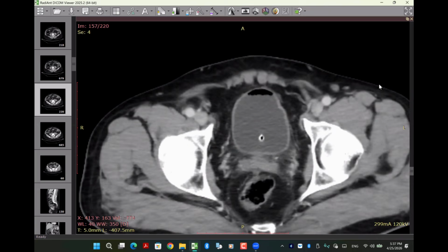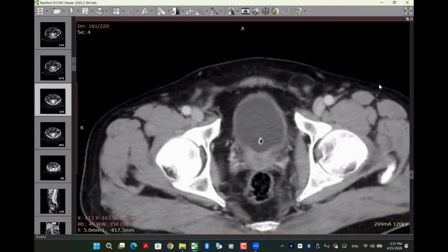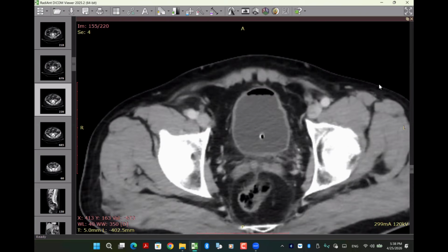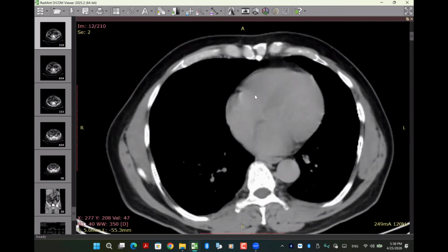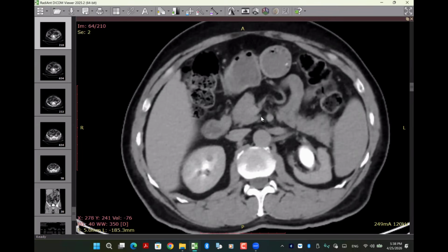Let me stop you for a second. Before the cystoscope, what else can you do with this study? Are you still missing a very important phase? We can see the delayed images of the study. Okay, let me give you the delayed images of the study. You can scroll, go ahead.